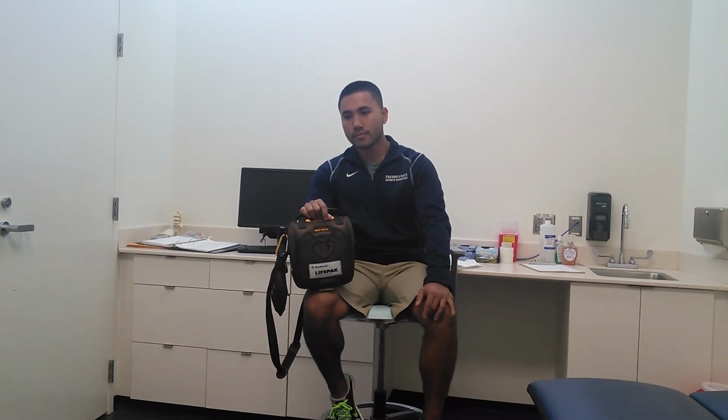Once that is all done, the shock is delivered. You want to reanalyze the patient to see if they have a heart rhythm or not. If not, I believe you do CPR on the patient, or you check if they need another shock or not. That's it.